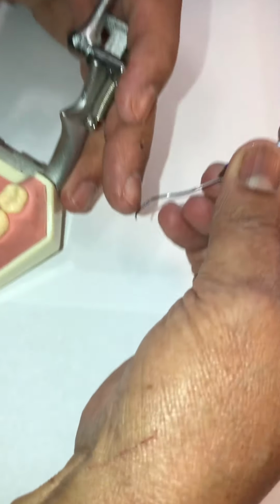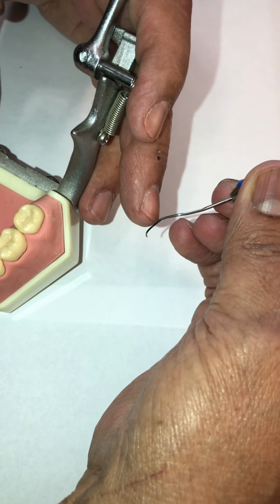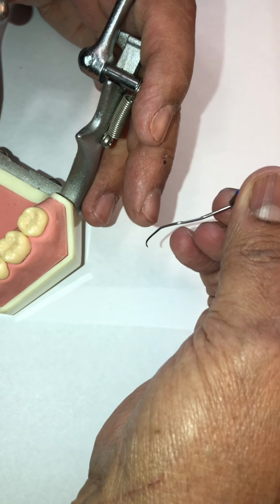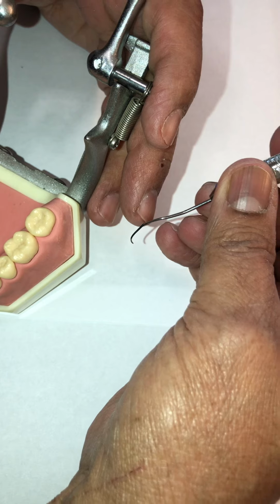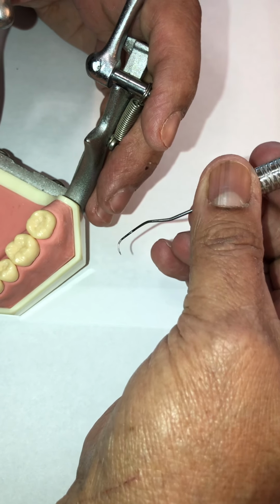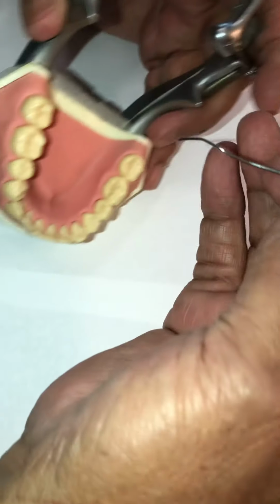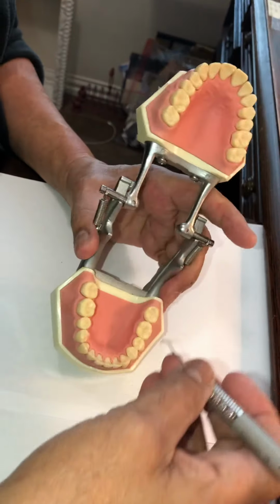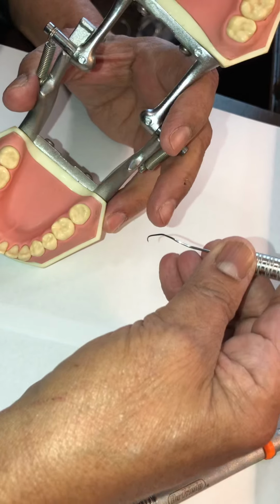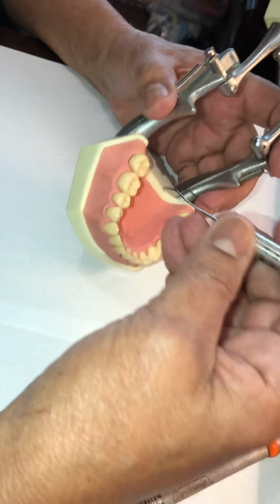And so there's the terminal shank that I have colored in black. So there's the first bend, okay? Anywhere you place this, here's a bend here, and here's a bend here, okay? But this is your visual clue. So in any sextant, whether I'm buccal or lingual, or anterior, or lingual of anteriors, I'm always going to look for that first bend, and it's always going to be distal, okay?